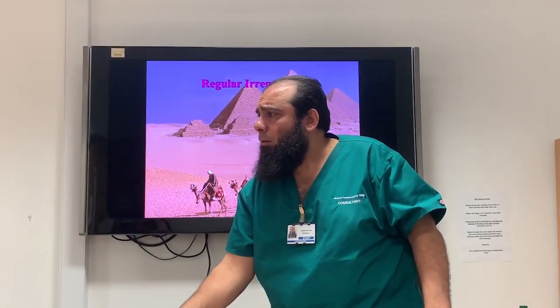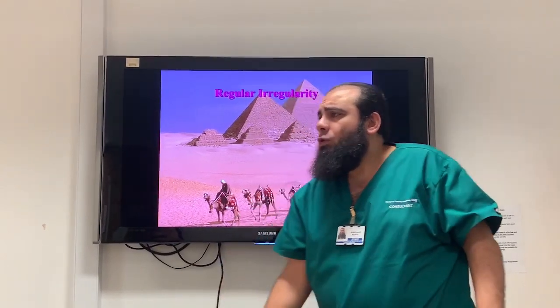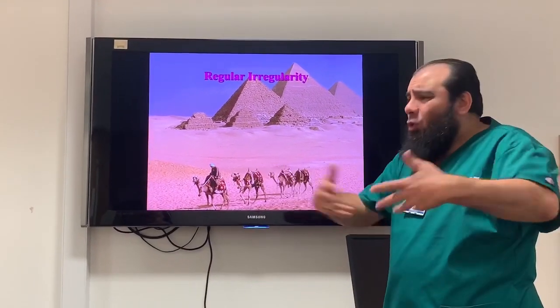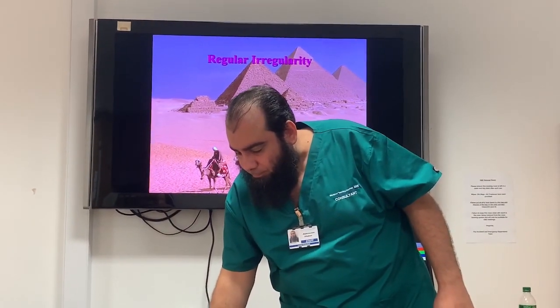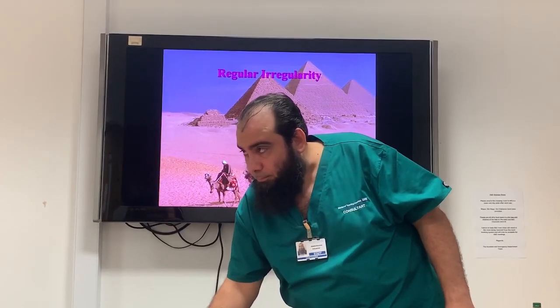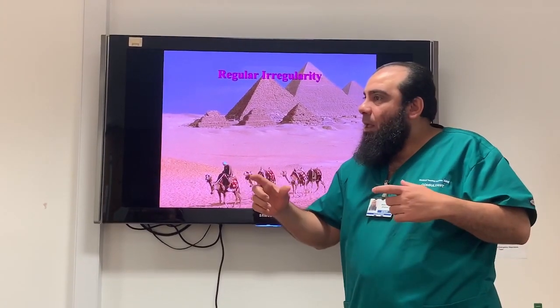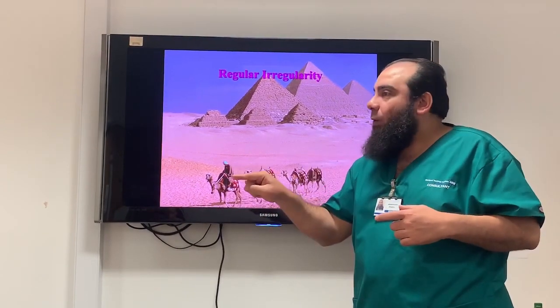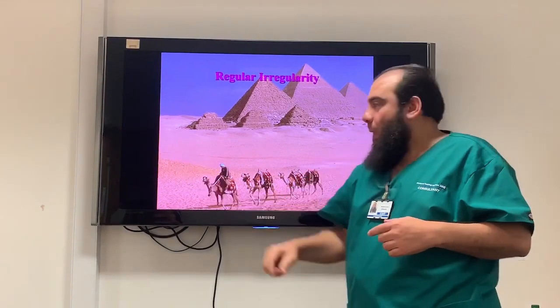What's that? Irregularity. Any pattern there? No pattern. So it is irregularly irregular. What about that? It is not regular because the intervals are different, but there is regularity in the irregularity. It means there is a pattern going on. Have you got that? Okay.